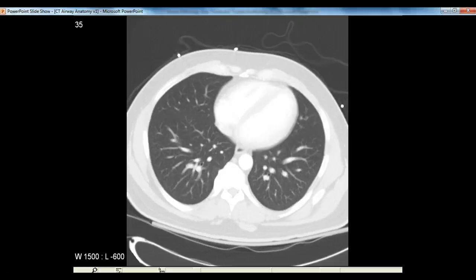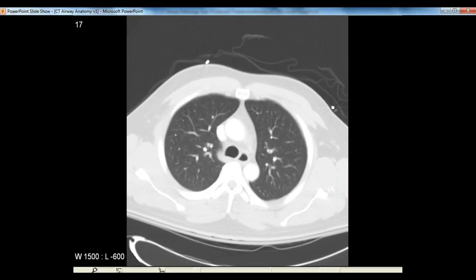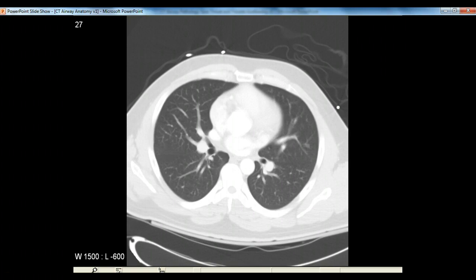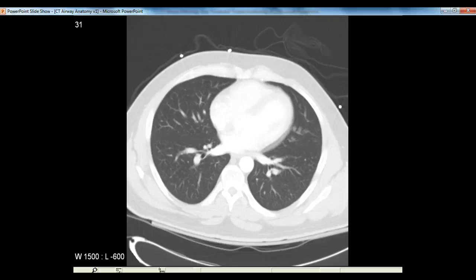In the meantime, right in the center of the chest, we've got our aorta and then our heart. So by the time we get to the heart, the airway has already divided into the main stem bronchi. There's no longer a central airway structure. We're now feeding the lungs. We continue down, that's the heart in the middle there.